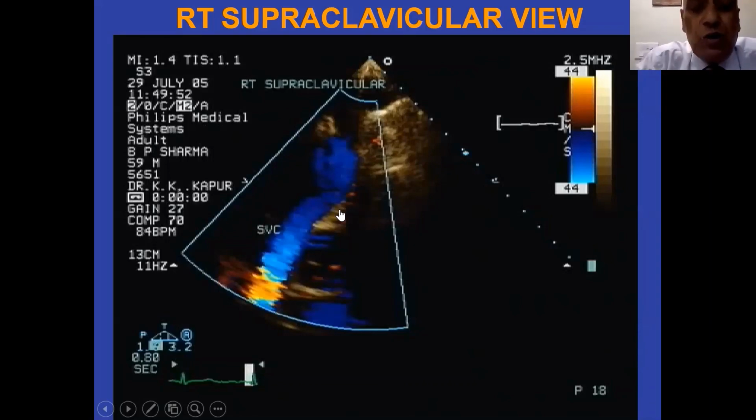As you look from the suprasternal position or the right sternal position, you can see the retroaortic innominate vein. Normally the innominate vein goes above the ascending aorta; here it is going behind the ascending aorta, and sometimes it can get encapsulated by the aorta, caught between the aorta. But generally it's a very rare condition.